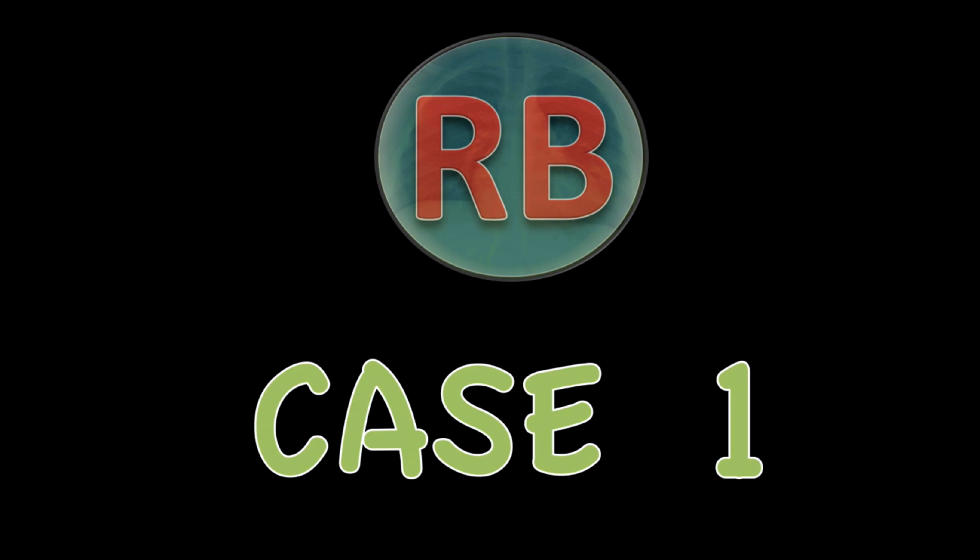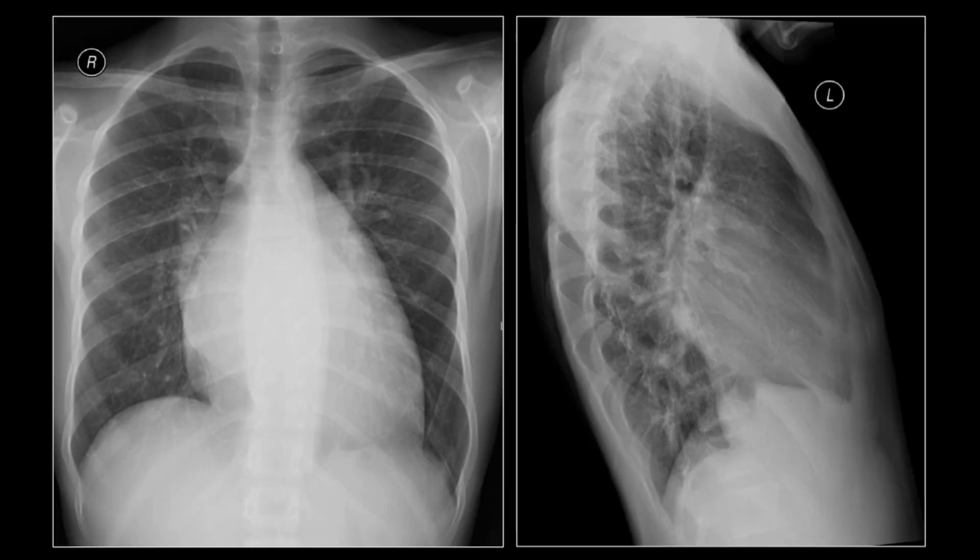Now let's start with the first case. This is a young male patient who presented with shortness of breath. The case that you're looking at here is actually a common case in practice, and it's also one of the exam favorites. The first thing you probably noticed is the cardiac enlargement. This is easy, that's obvious.